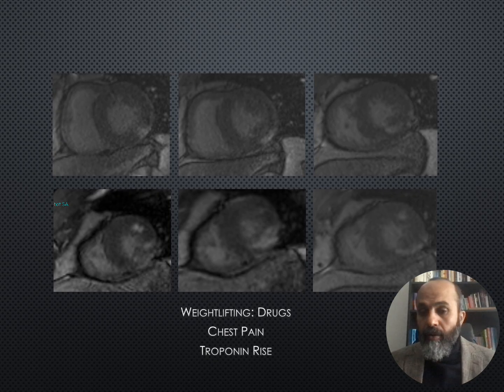Another case is an athlete with low function; we said never moderate, never severe. So if it goes into the moderate range and you know it's an athlete causing symmetrical hypertrophy, but on the late gadolinium, in an athlete adaptation, a physiologic adaptation, you will never find a late gadolinium enhancement. If you find one, then always think there is another factor.